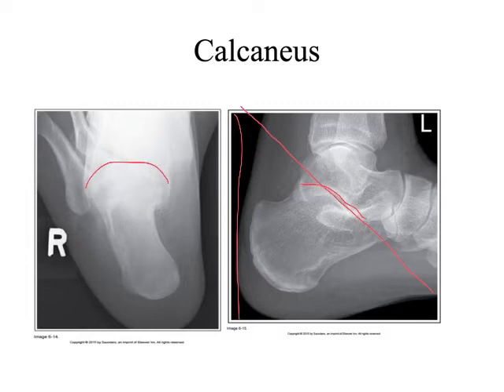We're not going to be able to see the metatarsals very much on this image. That's really not where our focus is. Our focus is primarily on the calcaneus. And the main thing that we're looking for probably with an image like this is some kind of crazy dislocation or just a straight up fracture, right? Pretty rare to fracture, but I've seen it happen more often than not, especially with motorcycle accidents.